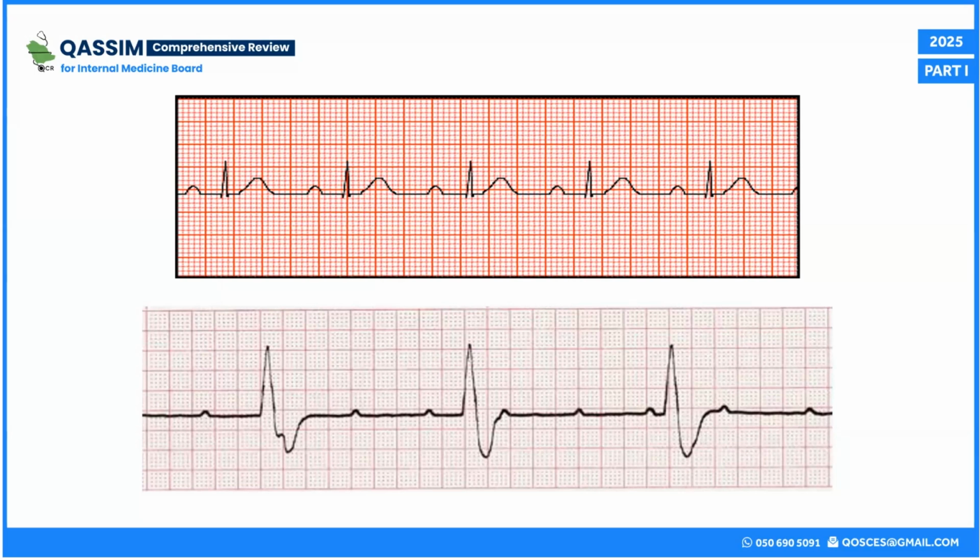You could see the abnormality, that positive deflection in the down slope of the ECG that indicates the P wave. The P wave tends to go in its own rhythm and at its own rate, while the QRSs go at their own rate. They are not associated by any means. So this might indicate a complete heart block.